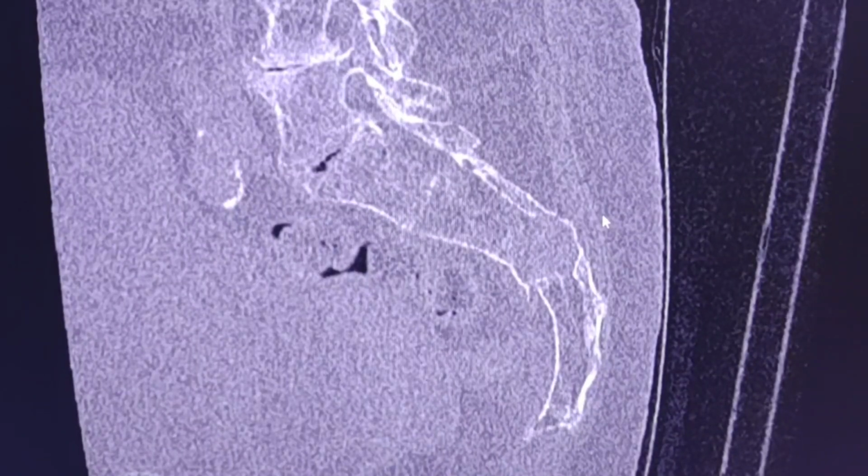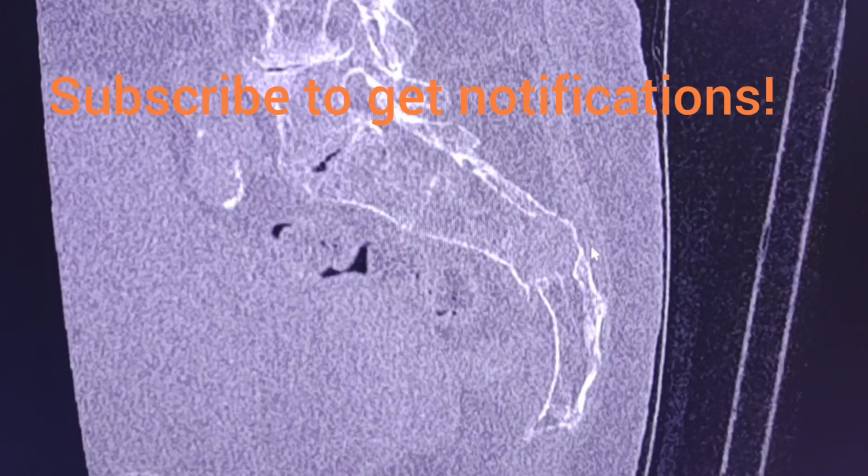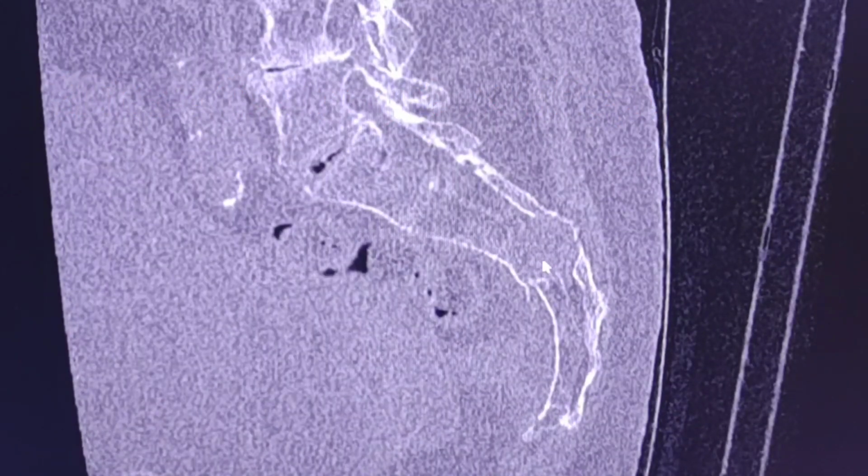So given the history of the patient, of the recent fall, the acute fall, and the new fat droplets in the subarachnoid space in the CT scan of the head, we recommended further evaluation with a CT scan of the whole spine. And here we can see an acute fracture in the sacrum at the level of the S3 vertebra. There is also evidence of a perineural Tarlov cyst in this region as well.